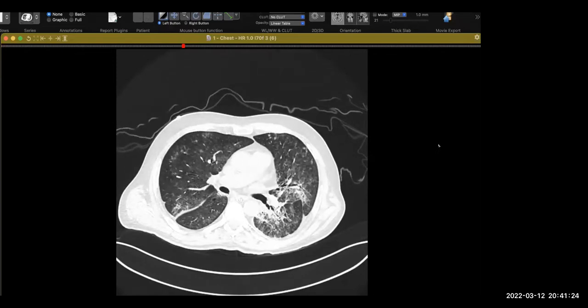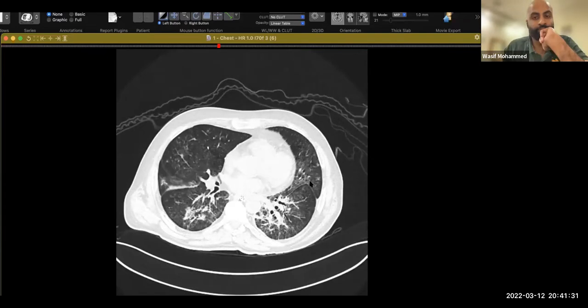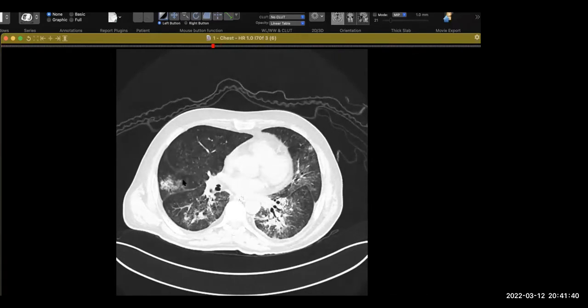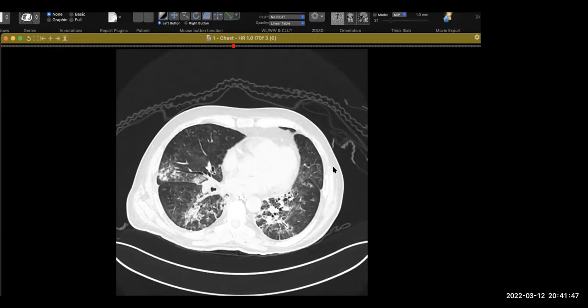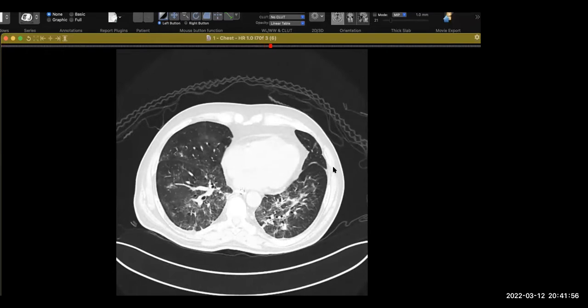There is a bit of fibrotic change I can see over the left lung, and I can also see some infiltration on the pleura, on the fissure. This looks like a bit of a fluid infiltration, and a pleural effusion is uncommon in the case of pneumocystis carinii. But still, I would first go with the diagnosis of a pneumocystis carinii infection.